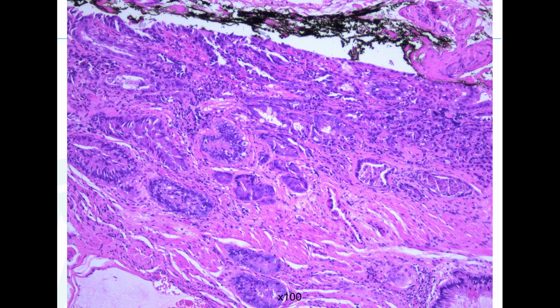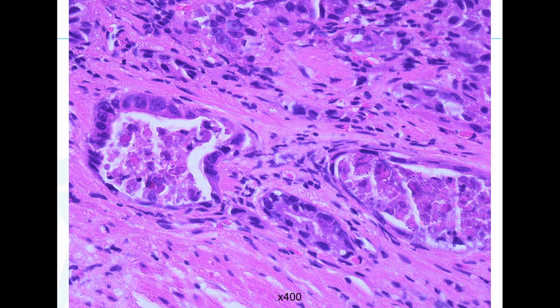They are roundish, they have nucleoli. You see the crowding up here, and this is basically an intramucosal carcinoma which invades the muscularis mucosae. And here you see these glands horizontally arranged that are filled with debris, and this is a very good sign for an invasive carcinoma, intramucosal.